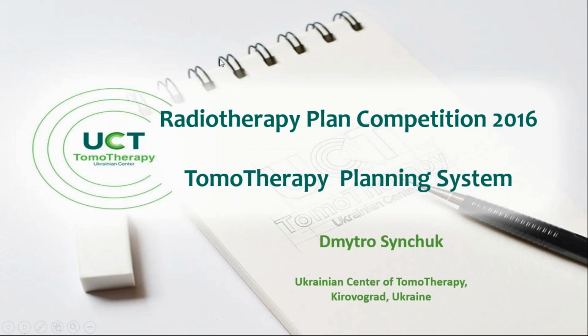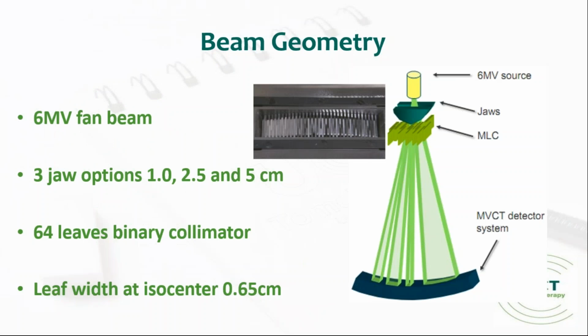Hello, my name is Dmitro. I'm from Ukraine, and today I will tell you how I did my plan on the tomotherapy planning system. So let's begin with what tomotherapy is and what differs tomotherapy from other treatment delivery systems. What is different is the beam geometry and also the way the dose is delivered to the target.